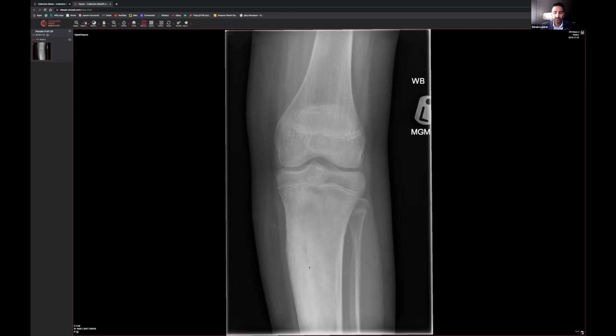You could try and put a differential, and one would hope that it's nothing more than just maybe osteomyelitis. Maybe there's a Brodie's abscess, which is another version of osteomyelitis as it progresses further and further, i.e. infection of the bone. But you have to be careful because it could be anything. It could be Ewing sarcoma, osteosarcomas, all sorts of things.